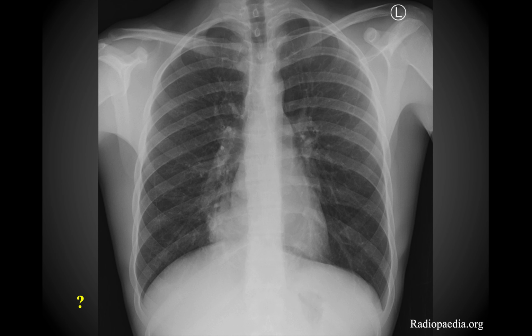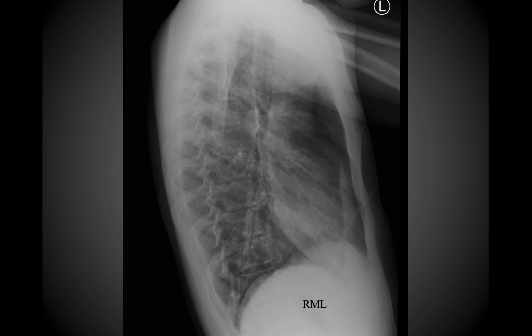So in this image, what you should be noticing is that on the patient's right side, looking at the mediastinal structures, you don't have a good clear distinction or a full border of the right side of the heart. And again, you can see right down here that there is this additional opacity on the chest x-ray. And then if you go to this next image here, you can see that it is consistent with pneumonia of the right middle lobe of the lung.